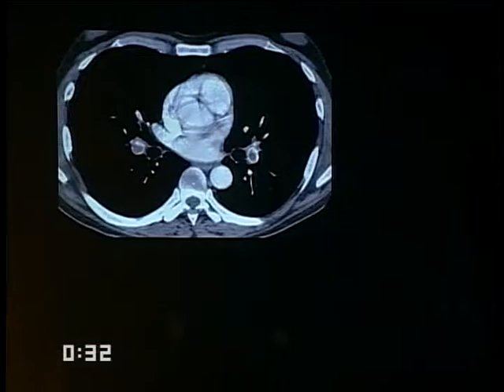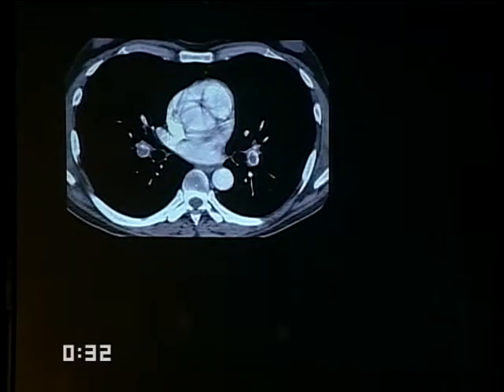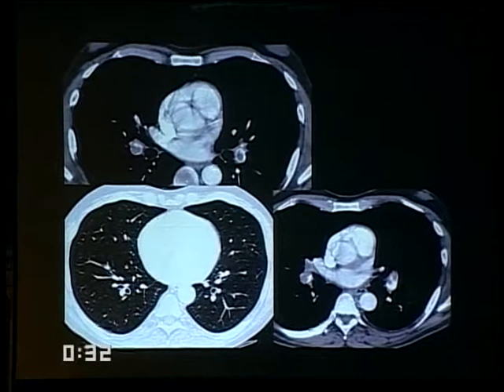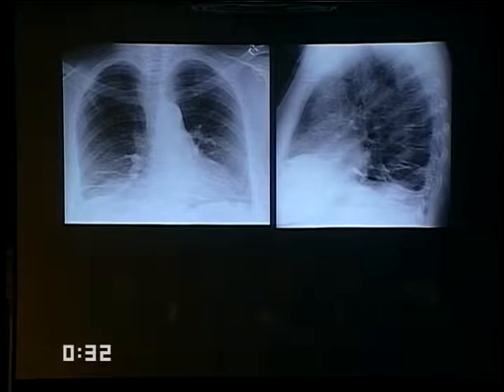And indeed, this patient did have massive and extensive pulmonary embolism. He had it, as you can see, on both sides. I don't know why that left hilum looked particularly abnormal, but certainly this is a very classic acute pulmonary embolus. And in fact, as we go down through the lungs, we can see the extent of that PE. So this is one of the things that we can look for, an abnormal hilum that has become more prominent and has decreased perfusion distally.